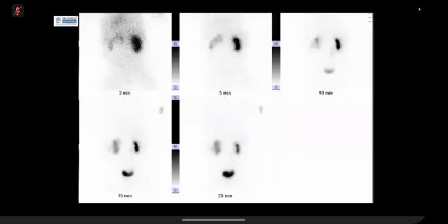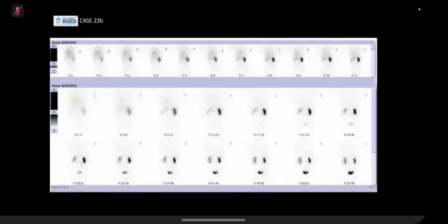So this is the original scan. Oh crap! Thank you. So I got my rights and lefts confused. So apologies. So this is the PUJO. So there's a PUJO. That's the initial one. And then this is the one that shows you just spot images, which is probably a lot easier. So this is uptake in the normal right kidney, so the right side.